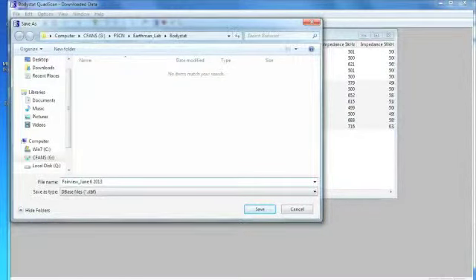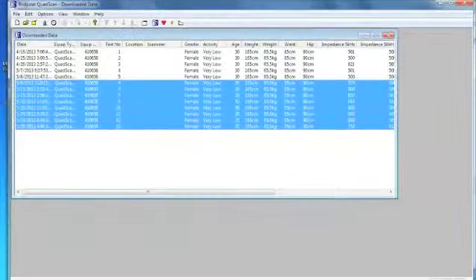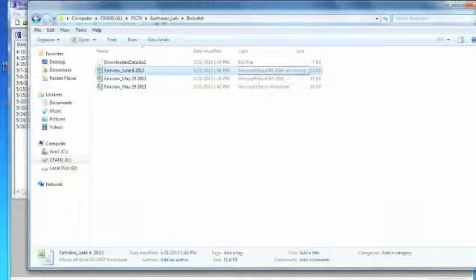And again, I'm going to do .xls, and you could do .xlsx if you'd like for the more up-to-date version of Excel. So then I'm going to hit Save, and it's going to save it in that directory where I told it to save. And now what we see are my two Excel files, the one that I sent the previous week, and now this one here that is simply showing test numbers 6 through 13.